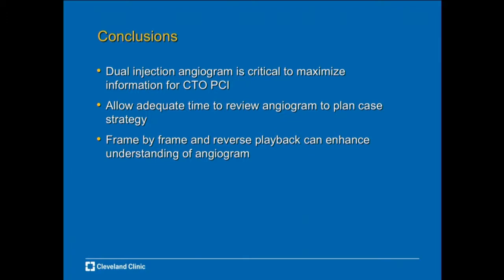So in conclusion, the dual injection angiogram is really critical to maximize your information for CTO PCI. You have to allow adequate time to review the angiogram in order to strategize the case. And as a final tip, frame by frame and reverse playback can be very helpful to really maximize your understanding of what you're looking at.